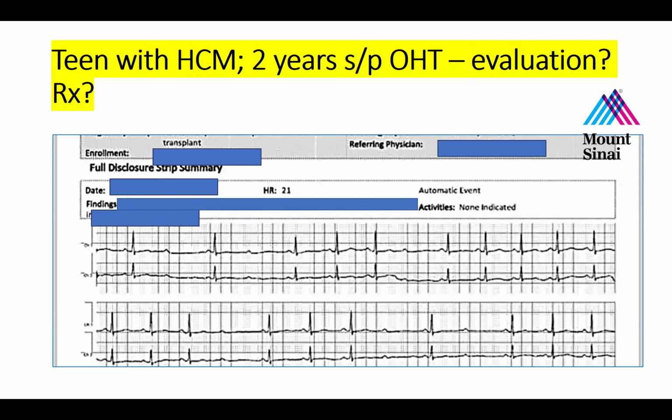Okay, why is it not first degree? Looking at the interval between the P wave and the R wave, we would see prolongation, greater than 200 milliseconds, and here it does not look like that. So the PR interval is normal. You mean on the conducted beats? Yes, correct, the PR interval is normal. I agree with that. So then why is it not third degree heart block?